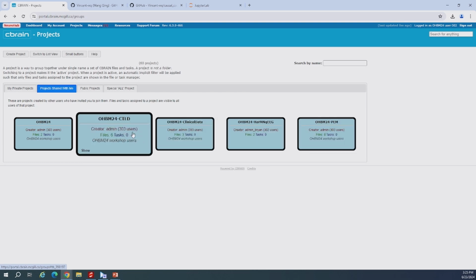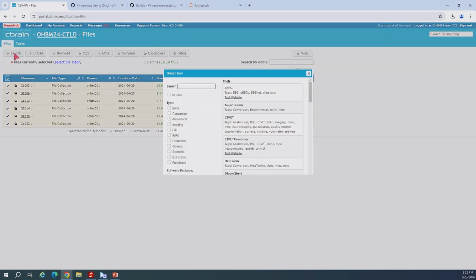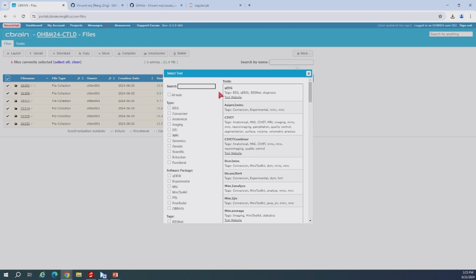for processing, okay? So now Brian selects, and you have all this data already in your project. And then you just need a click, and you can go and launch the task. See that the step that takes more time is preparing the data. You need to prepare your data.